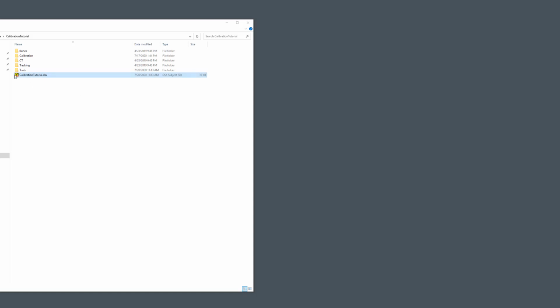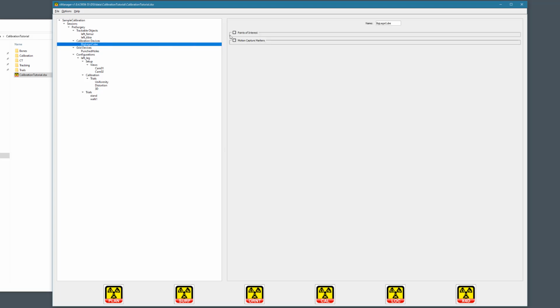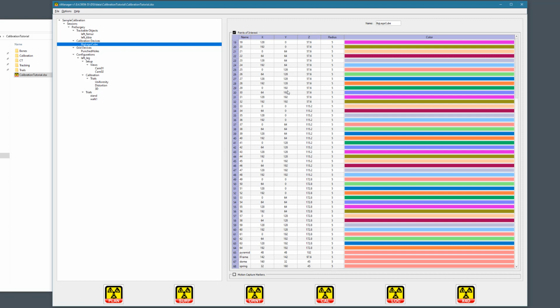This tutorial does not cover creation of the subject file, but let's take a quick look at it to highlight the components that are needed for calibration. The first component is a calibration device. In this case, we're using the big Lego cube designed by the X-ROM group at Brown University. It contains 64 tantalum beads embedded in a frame made of Lego bricks. It also has 4 uniquely shaped tokens to help identify the beads in the X-ray images. The XYZ locations of the beads and tokens must be defined here, along with the radii of the beads.